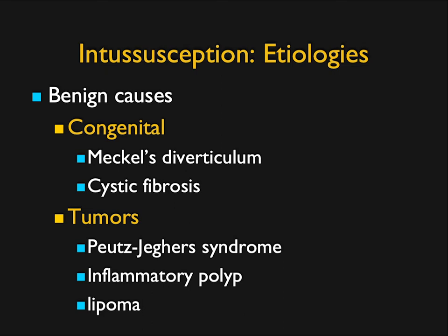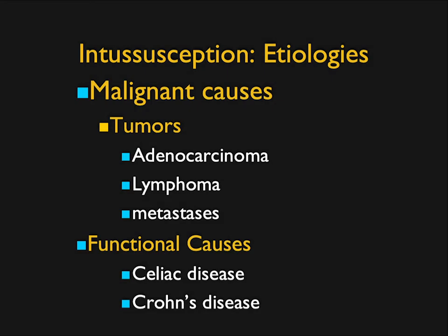Intussusception can be caused by benign causes like Meckel's, tumors, inflammatory polyps or lipomas, or it can be malignant tumors, be it adenocarcinoma, lymphoma, or metastasis such as melanoma, for example. And it also can be functional. Celiac and Crohn's are two possibilities.